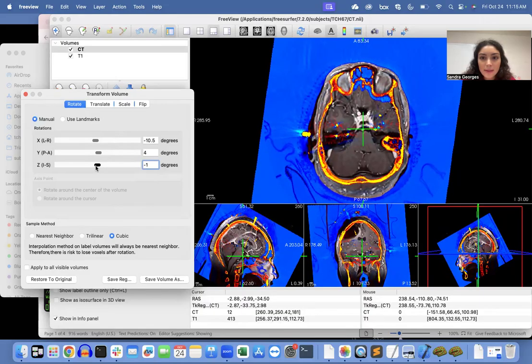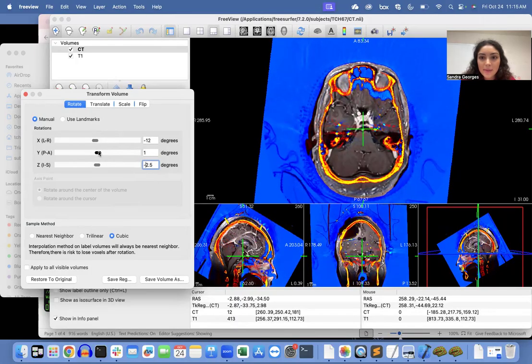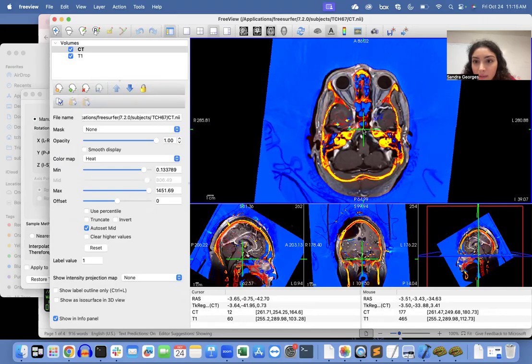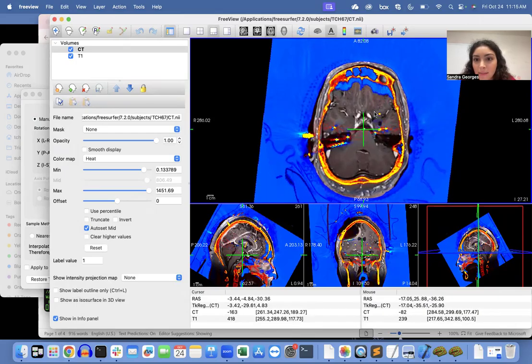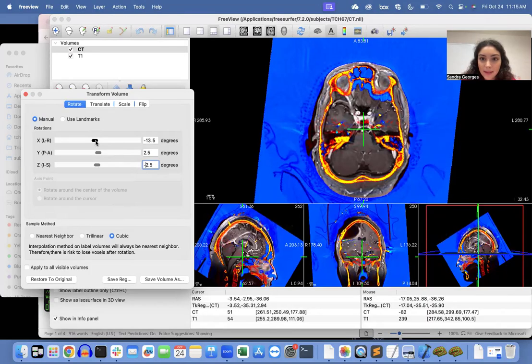Okay. Not here. Maybe here. See how one of them has the bone covering, one of them doesn't? That shouldn't usually be the case unless one of them comes in first. Should not be true. So it's still kind of off. I'm gonna keep manipulating, but it's getting there. This part definitely takes a little bit of time.